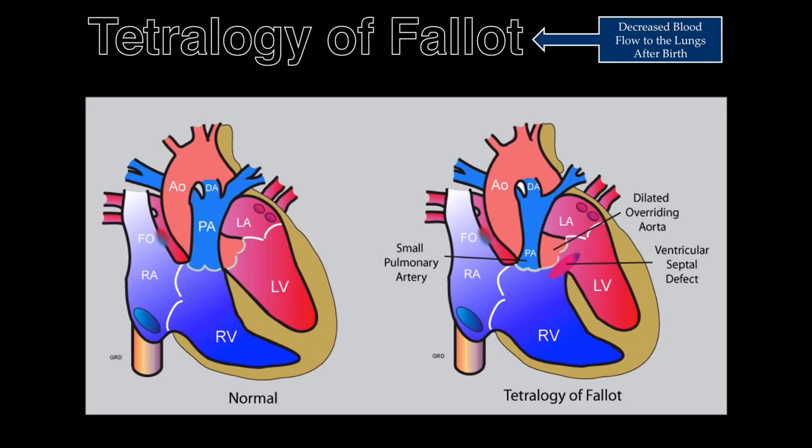and right ventricular hypertrophy. However, in the fetus, the right ventricular hypertrophy may not be evident. For this reason, the 4-chamber view of the fetal heart may appear to be normal. Prenatally, a dilated aorta that straddles a ventricular septal defect is the most common finding. The pulmonary artery may be normal, small, or enlarged, the latter occurring with an absent pulmonary valve.